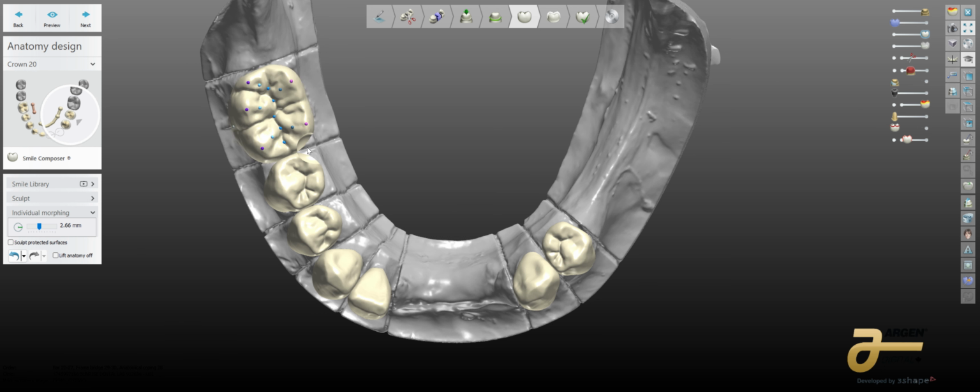And I need to have a rest seat for a ring clasp that's going to come around from mesial to mesial. We're going to have a little tip of a clasp here that's going to come around. It's going to balance this area. And one of the reasons why these are double abutted is because these teeth aren't tremendously great, and we have some issues. We're trying to get some longevity out of this case based on over engineering.